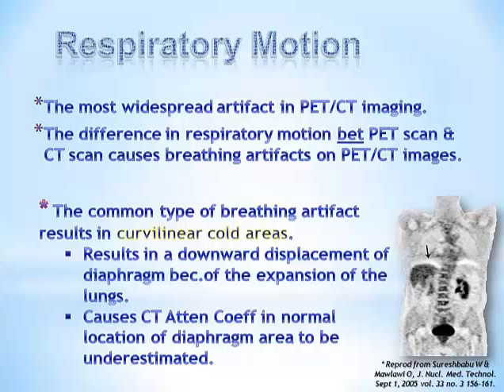And this is because they represent air rather than soft tissues. So this underestimation results in curvilinear cold areas being represented, as we can see in this image, in the area of the lung diaphragm interface.